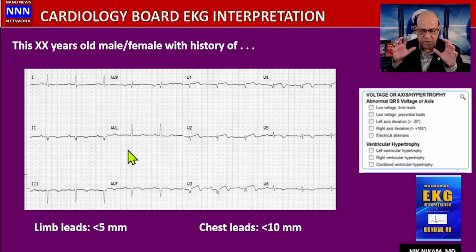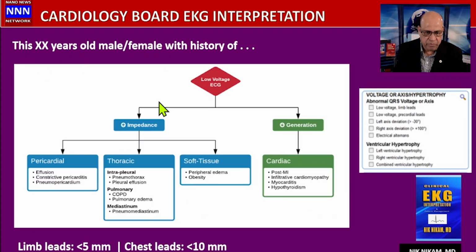Cardiology is all about putting the pieces of the puzzle together to come up with a composite analysis of what this patient has, what tests we need to do, how we manage these patients, and how well we communicate our messages to the patient and their families. Okay, here is a beautiful chart looking at low voltage from two different mechanisms.